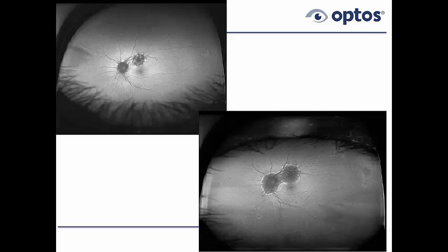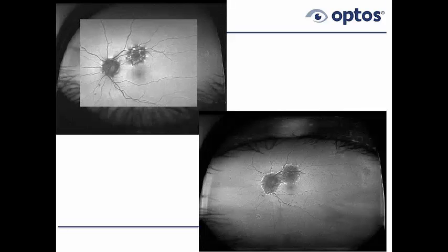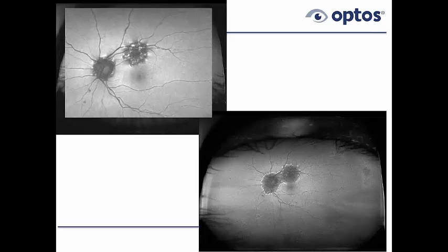As far as Plaquenil goes, at what frequency should the test be done in autofluorescence? Well, some people would suggest doing it early on within the first year or so, and then if there's nothing, maybe skip to year 5, and then probably on a yearly basis. The statistics have changed a little bit. It's a little bit more common than we had thought previously. If you're a Plaquenil patient for 10 years on about 400 milligrams, you have a 1% chance of having a serious retinopathy, having toxicity. Some of the newest studies is one out of California that Michael Marmor was involved with, and my interpretation of that study was it's actually more common than we thought previously.